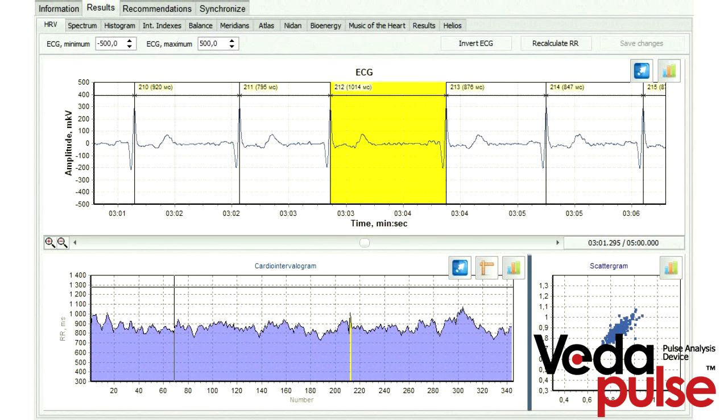In conclusion, let me remind you that our software also marks zones, intervals that differ in length by more than 20% from the average on this recording, and they are not exactly artifacts, so we don't need to edit them.